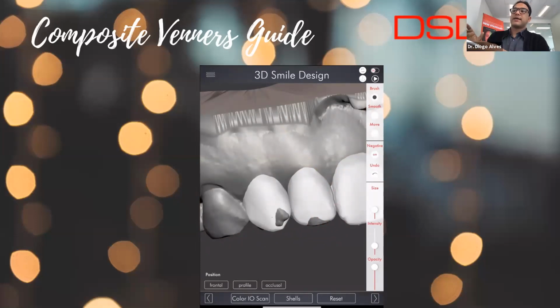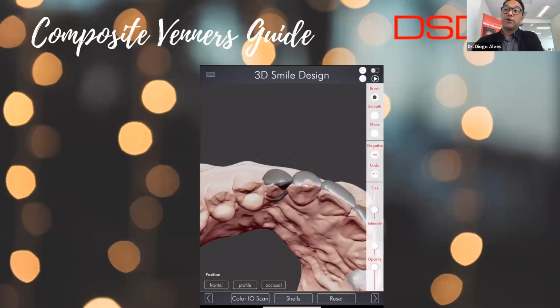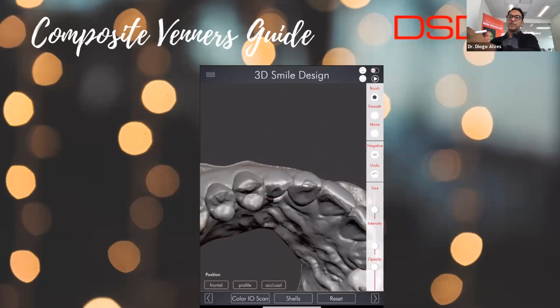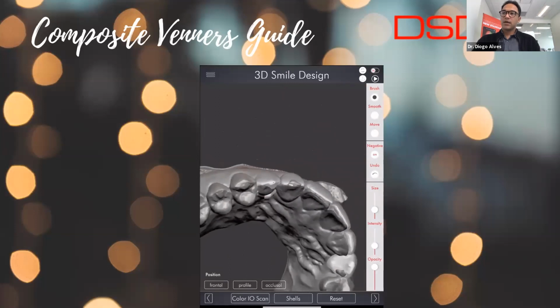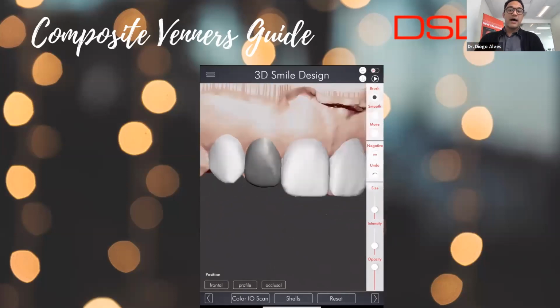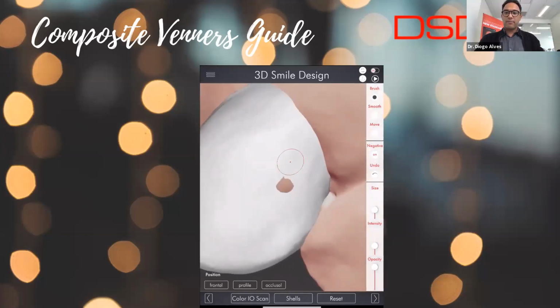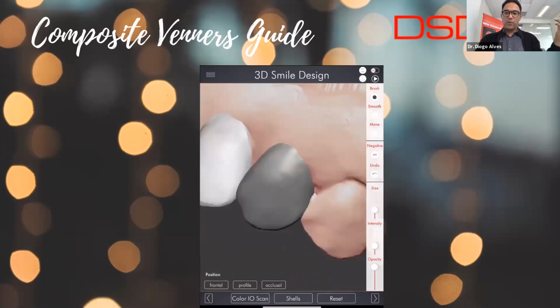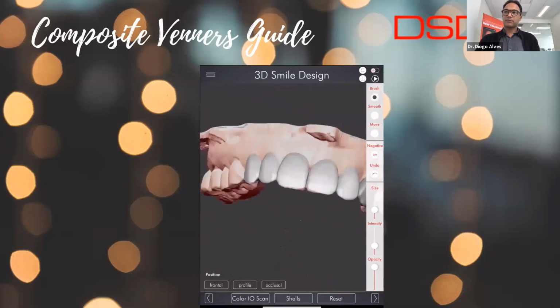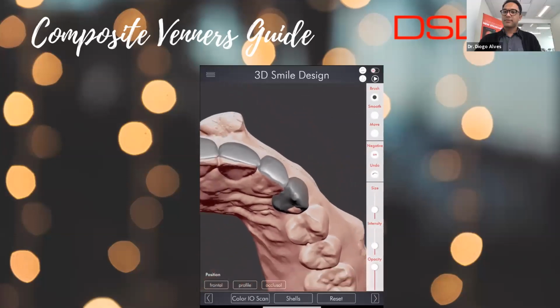So basically, this is after you prep on the patient's mouth, you will now either be preparing, or you can do that after you prep it. What do you like to do? How does your workflow usually consist of? Doing this first? It all depends on the case. In this case, since it's a simpler case, I just do all the designs all at once, so I can have it all ready for my patient, and then just do it all in one visit. Which is a huge benefit for the patient, right? I'm sure they love hearing that.